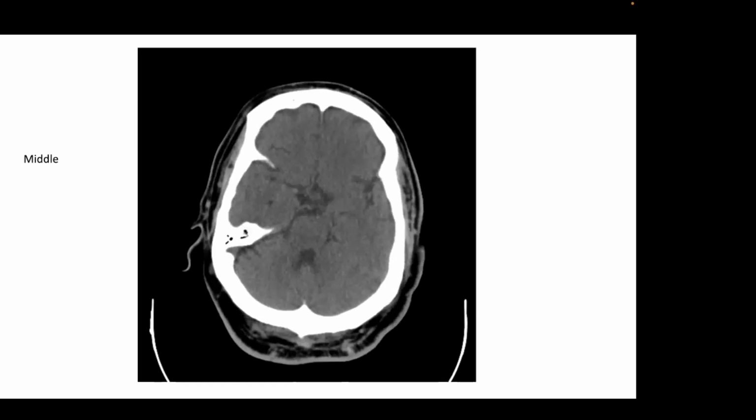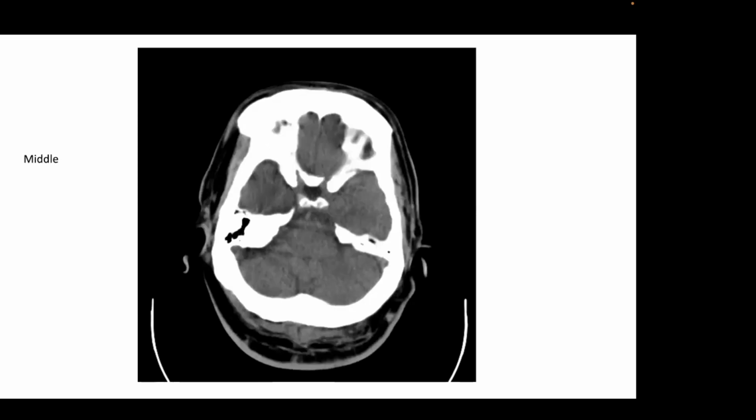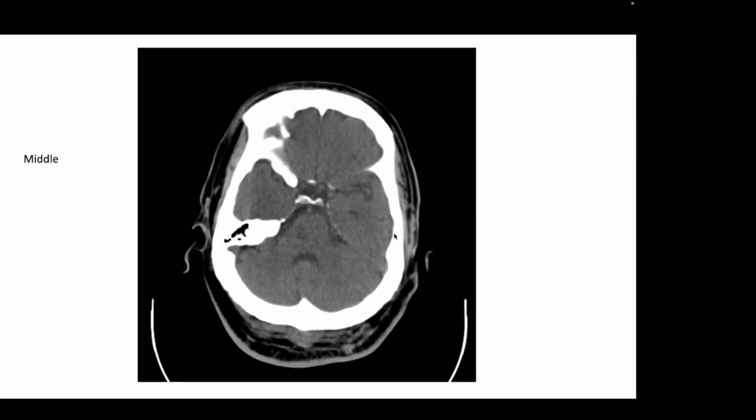So we're looking here, I'm telling you that the patient has unilateral symptoms. What you'll notice here is there's low attenuation in the pons. This is visible only on one slice, and you have the beam hardening artifact that of course goes through the petrous bone. And you could argue that this is more evident on this side because of the head tilt. So this is what I mean about the difficulty of making the diagnosis on CT. We have a combination of a lesion that's in the same place where we often see an artifact.